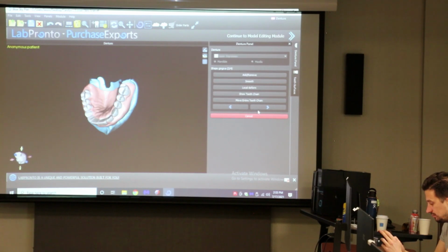Because it looked like it kind of got lost across the model. So sometimes it's easier just to go back and then dodge your frenums here. And then you've got your loop there. So you got the idea. Yep. And then offset, I think adding like 0.1, whatever, and then changing that. Yeah, 1.5, perfect. So somewhere in there. Next. I was just telling him, if it looks like it goes through there, it shouldn't make any difference. It's smart enough to know that, yeah.